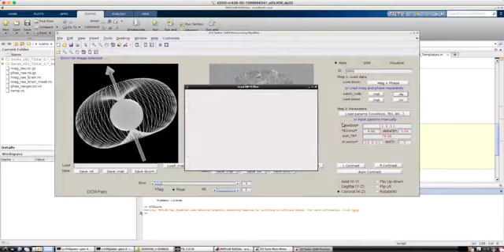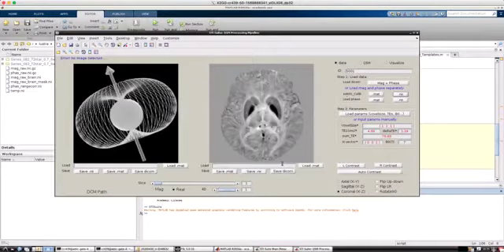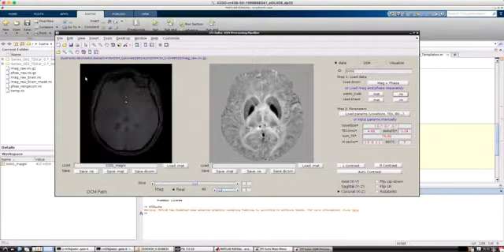So I just click the magnitude, and I just load the magnitude, the raw data. So I just load that there. I have to wait a bit until it says loaded something here, and the image will appear here on the left. I'll just wait a little bit.